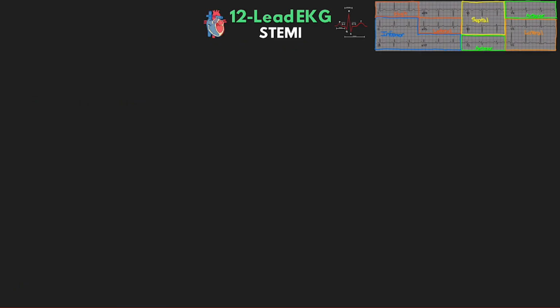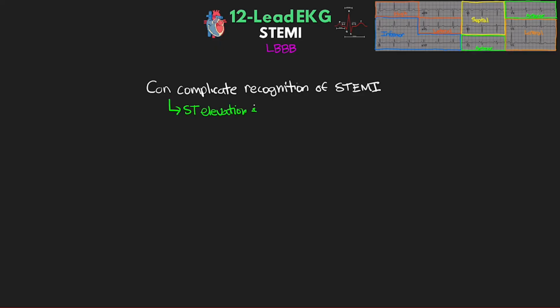All right, and then finally, the last thing I want to cover quickly here is left bundle branch block. So left bundle branch block holds a special place when it comes to MI. So first, it can complicate the recognition of STEMI, as a left bundle branch block can produce ST elevation and T-wave changes that are pathologically normal for these patients. That can either give the false impression of a STEMI or actually mask a STEMI that's taking place.